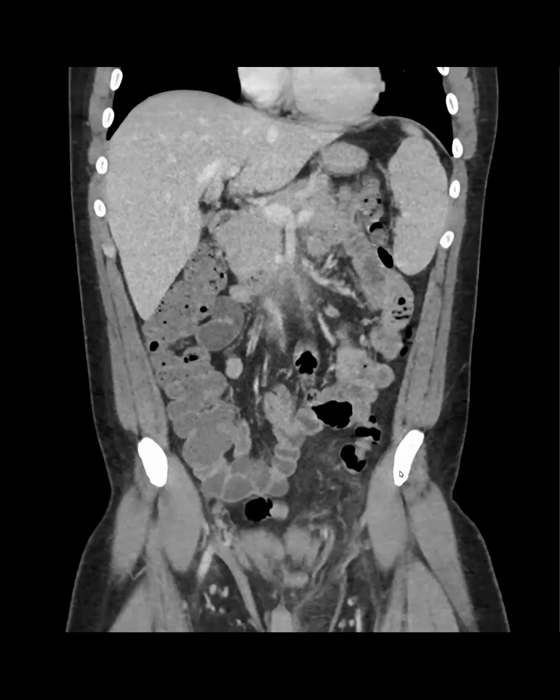Yes. Okay. Young male who came in from an outside hospital for pancreatic mass evaluation. By the time we saw the images, there had already been a biopsy. So we kind of know what it is, but prospectively, what would we have called this? Here's T2, here's pre-T1. CA19-9 was not up. No pancreatitis, no syndromes, nothing. Maybe neuroendocrine versus some other unusual tumor.